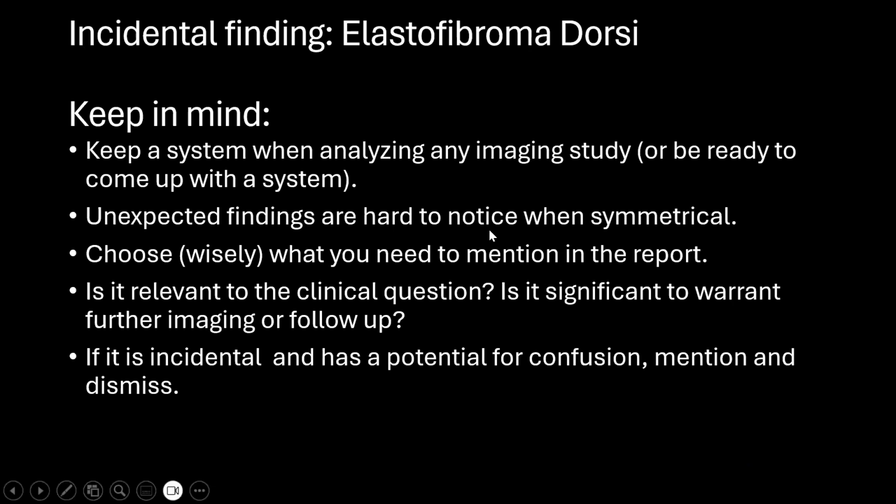Unexpected findings are hard to notice when symmetrical, as in this case, but it wasn't hard for our radiologist here. Choose wisely what you need to mention in the report. Sometimes when you're busy reporting emergency studies, you don't have the time to report any fine details that are non-consequential and maybe not significant. And most important, you ask yourself, is it relevant to the clinical question I have now? If it's relevant, of course, we will mention it.